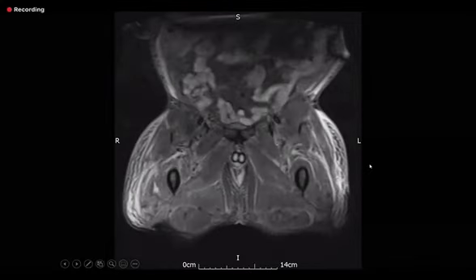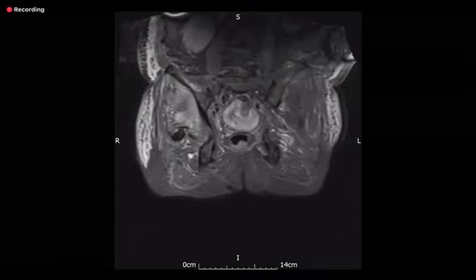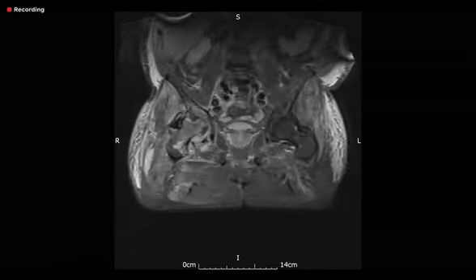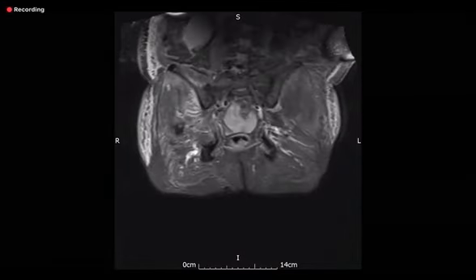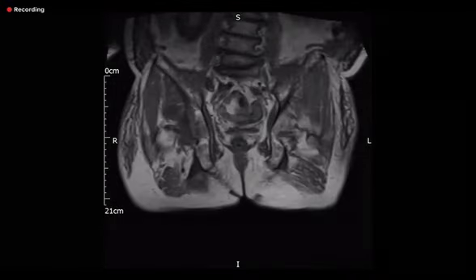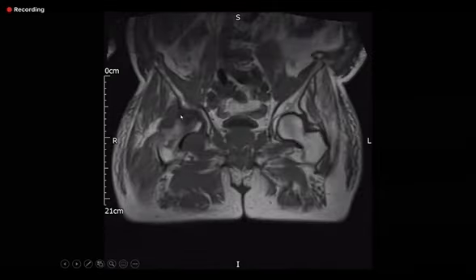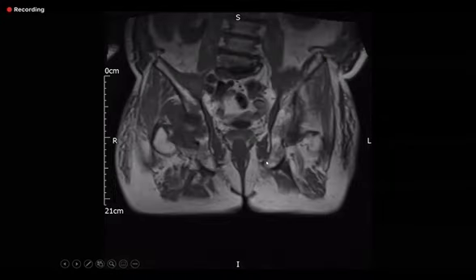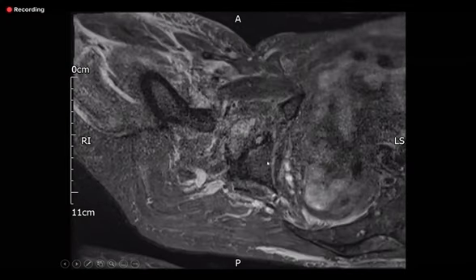This is MRI series 1. This is coronal T1. I can see there is abnormality centered at the right hip. Keep going, it's an easy case. Keep going to the next series. What's happening on this T1? There is reduced signal at the femoral head and also the acetabulum. Next, please. It's axial.